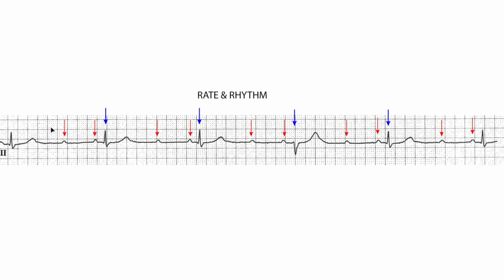Now, I'm not sure what I'm looking at here. I mean, I already know what this ECG is right before I started making the video, but realistically, if somebody threw this strip at me, I would have to answer a couple of questions to be 100%, to be definitive about my analysis, my interpretation. And here, I'm going to do that step by step. So first of all, I want to figure out some rates here.